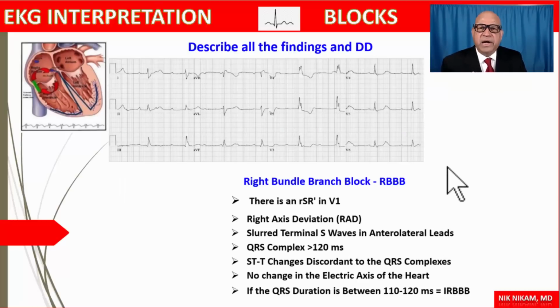Okay, what is your diagnosis here? Ooh, this is much more interesting than what I thought at first glance. Okay, let me start off here. First of all, we see P waves.